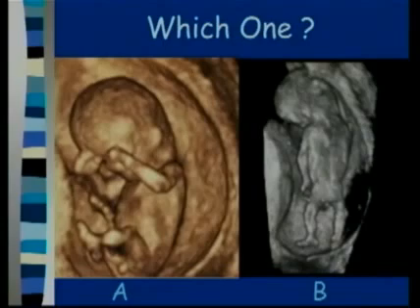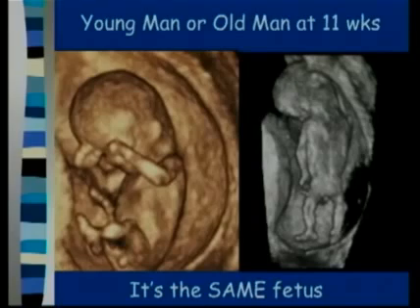So this is the final picture. Would you rather be fetus A or fetus B? Well, this is a trick because this is the same fetus.